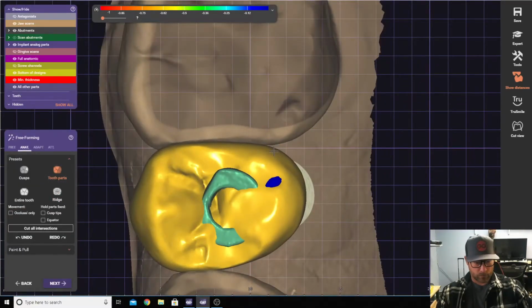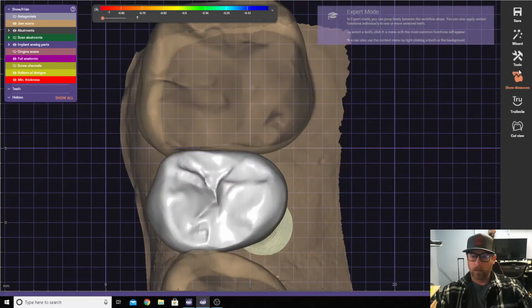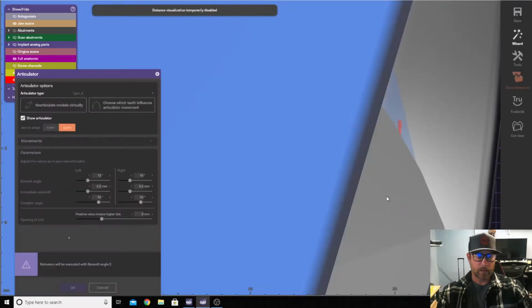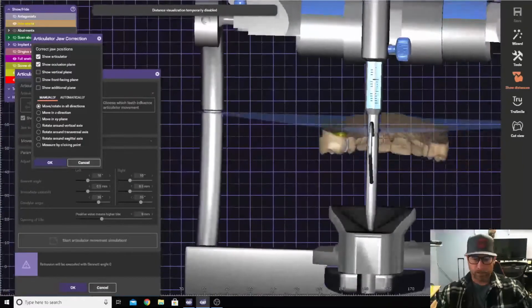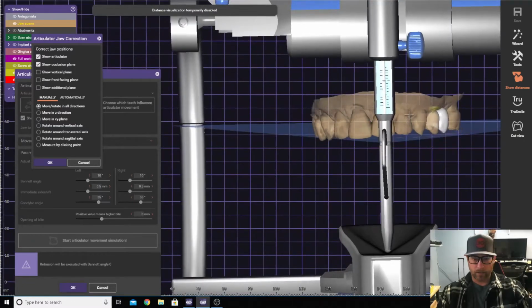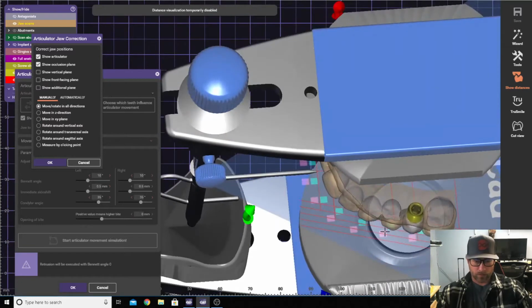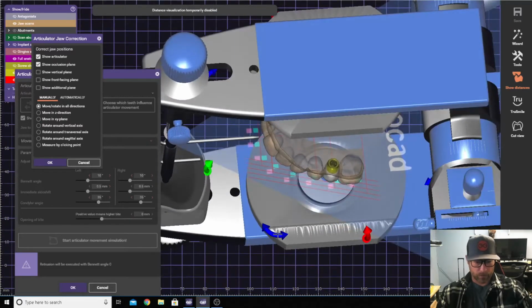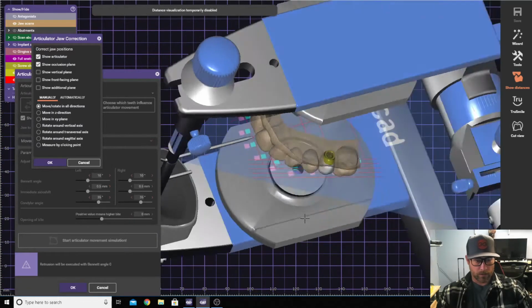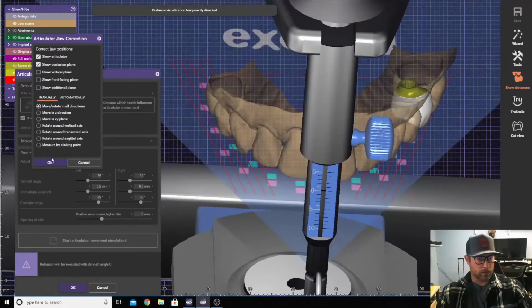Last thing I'm going to do is I'll now put it in the articulator. Where are you? There you are. And since we have canines and nice guidance all the way around on this cast, we'll use the Denar and not use this ramp of the Type A. We'll go ahead and line this bad boy up here using Galway's new system for lining up. It's quite nice. Hold down the control key and it will give you those arrows right here. And then it will only move in that one certain direction. And we'll go ahead and go OK.